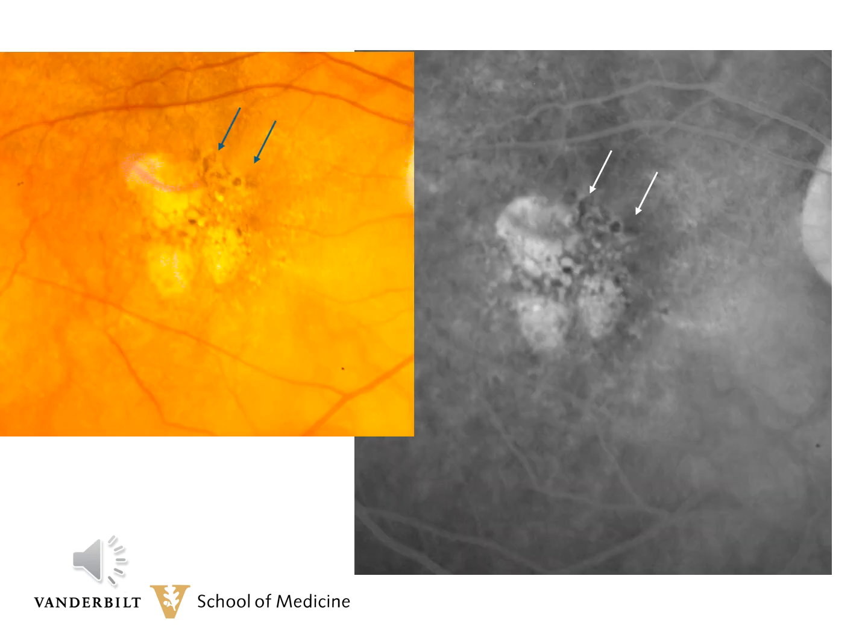This patient has macular degeneration with geographic atrophy and also some pigment migration, as pointed out by the arrows. The hypofluorescence caused by blockage of the dye by the pigment stands out very well against the rest of her degeneration. She also has hyperfluorescence from transmission defects, which will be covered in another chapter of the atlas.